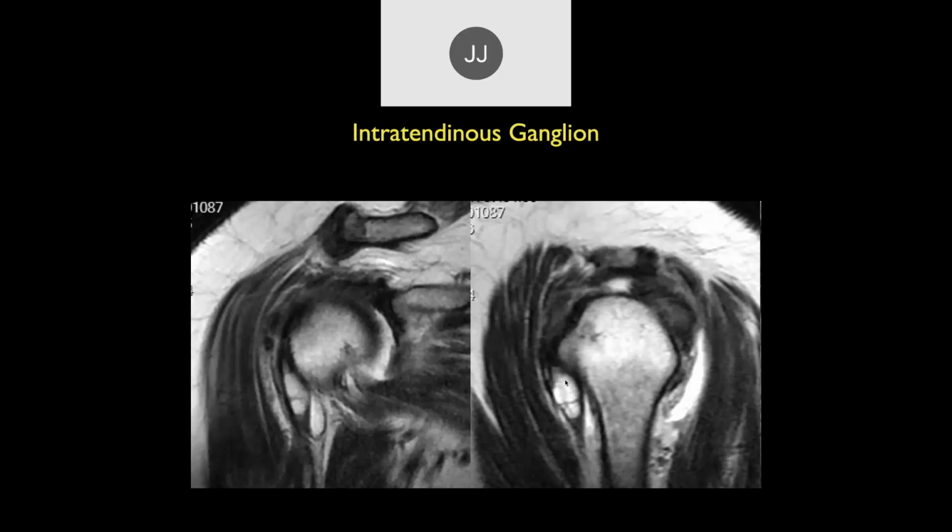What, John? It looks split, a ganglion cyst. Yeah, it's an intratendinous ganglion cyst here, which is basically a partial tear that communicates, and the fluid is pressed into the tear. It's pretty uncommon. Kind of what you see often in the infraspinatus, but it goes into the muscle. This is tracking down along the tendon, but hasn't yet made it to the muscle.